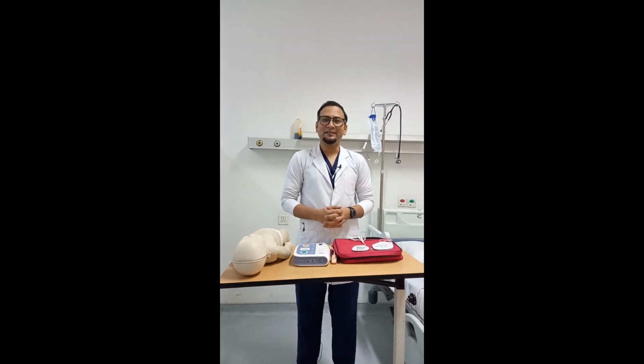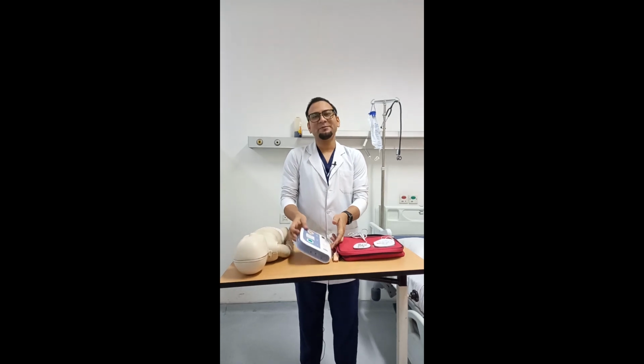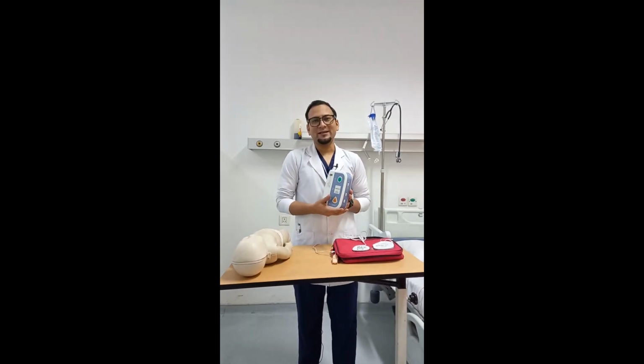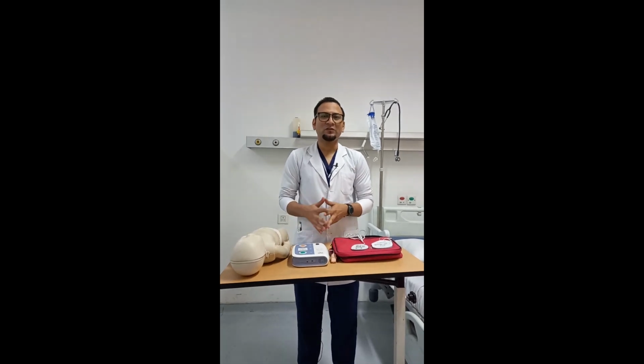So in the previous video we discussed the defibrillator. Now in this video we are going to show you the AED machine. As you know, AED is an automated external defibrillator. This is the full form of the AED.